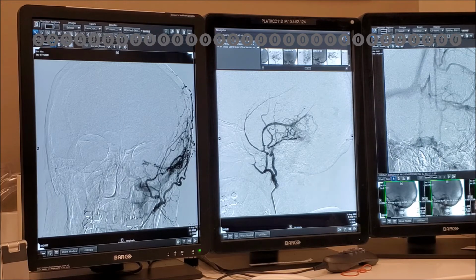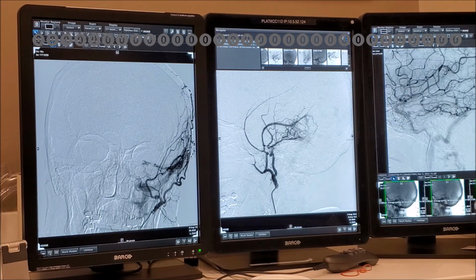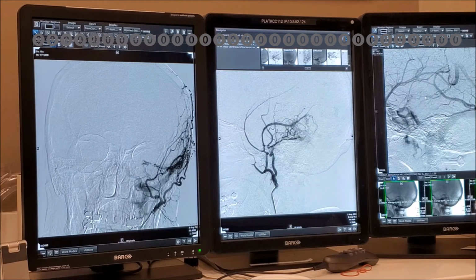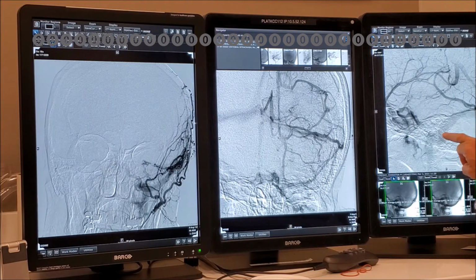But it's not normal. And then on the lateral projection, I think you do see it late. So the run should go late enough that you'll see the native cerebrovenous drainage there. So that's the left side filling and then contralateral flowing across. This is the right side. This one. The one going across is abnormal.